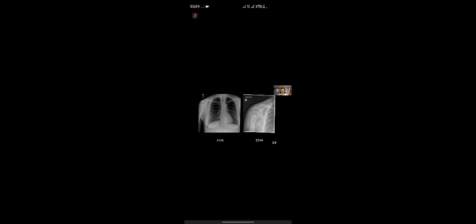Right. So the concept is that if it becomes malignant, it might eat up the calcification or the chondroid matrix. So there will be destruction and it might become more lytic or lucent. This particular case, I don't have good sequences.